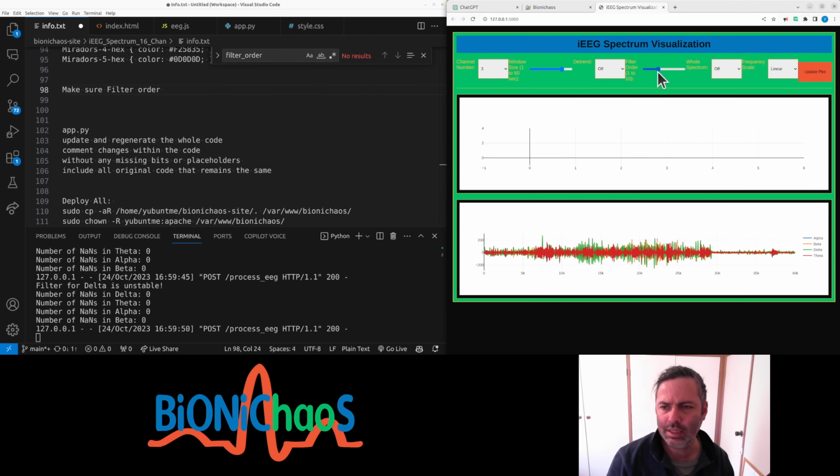So it's something fairly low. Okay, there will be a lot of work. What if it's the trend at first? Can it then go higher? No.